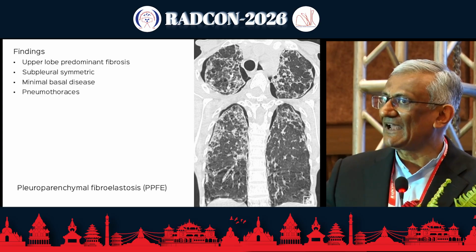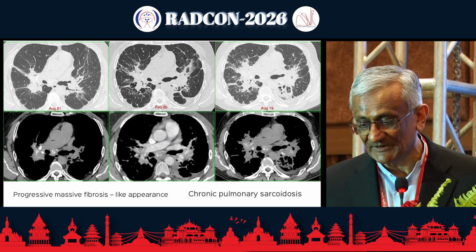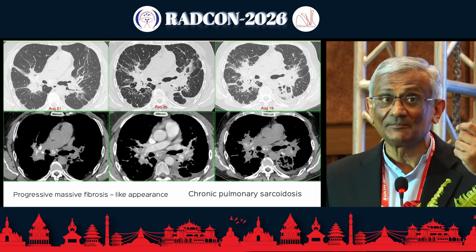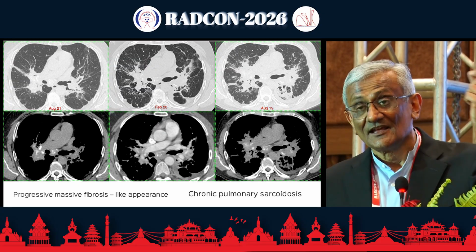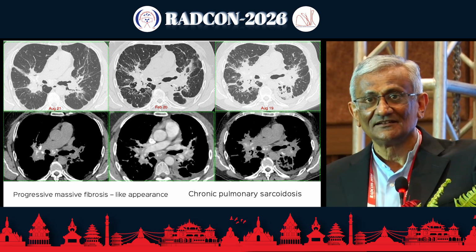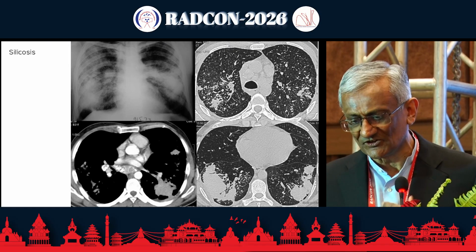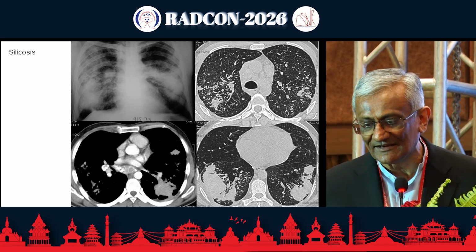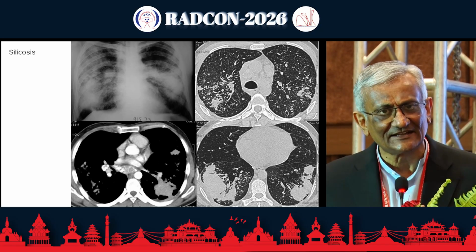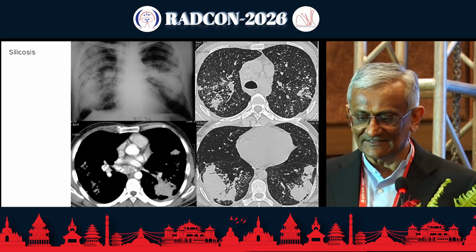And then we have other patterns. So here is a patient who looks like having progressive massive fibrosis with large perihilar areas with eggshell calcification. We would think of silicosis, but the patient had no silica exposure. This was biopsy proven. Anybody? What else can look like this? Sarcoid, right? This becomes stage 4 sarcoid, and the patient actually improved on treatment. And this is silicosis, where we have nodules of varying sizes with progressive massive fibrosis, with eggshell calcification, conditions that also occur as fibrosing ILDs.